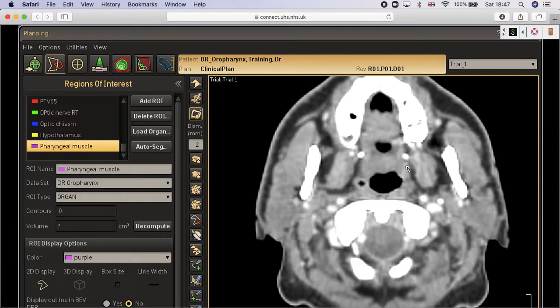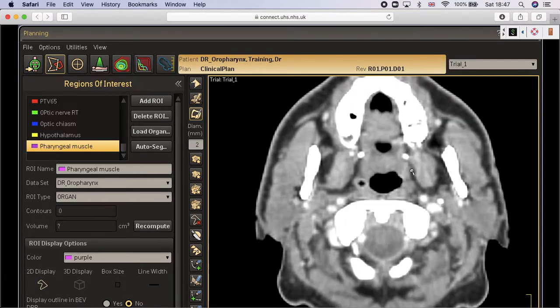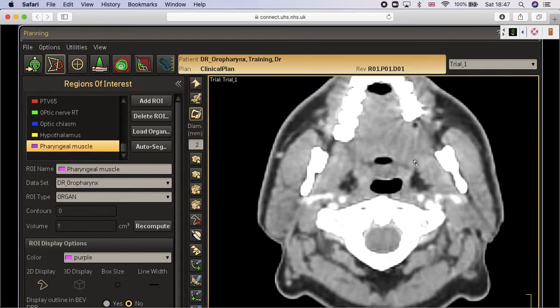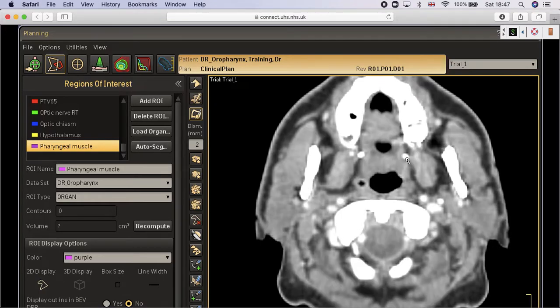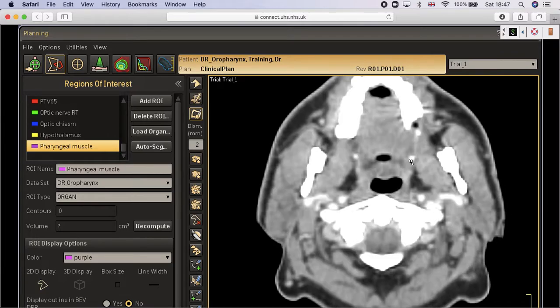We know something called the pterygoid plate. We know the pterygoid plate, we know the pterygoid fossa, but maybe we didn't know, at least me, that the lowest part of the pterygoid plate, this tiny bone here, is called the hamulus of the pterygoid plate. So the end piece of bone here is called the hamulus.